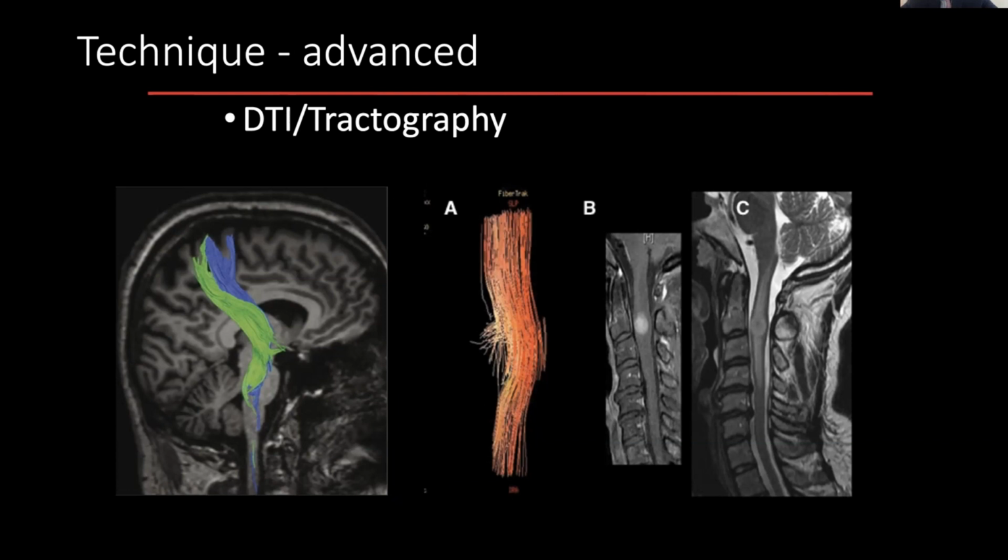So yeah, in acute stroke, particularly acute to early subacute stroke, you see restricted diffusion in the brain following the stroke. But just to put that in context, the same technology is useful in terms of evaluating white matter tracts to some degree, because water will flow along the path of a white matter tract. It's flowing adjacent to those tracts rather than actually in those tracts.